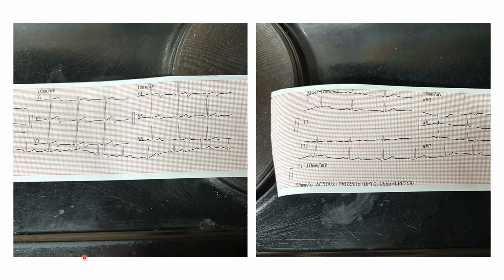So as our young doctor on the previous slide was telling us, we've got this elderly man presented with pain that had since disappeared. And this is a real case that was sent to me by Dr. Suji, so thanks to him as well. And in this, we just want to cover how we would analyze this ECG. So we have this patient where all of the pain has subsided.